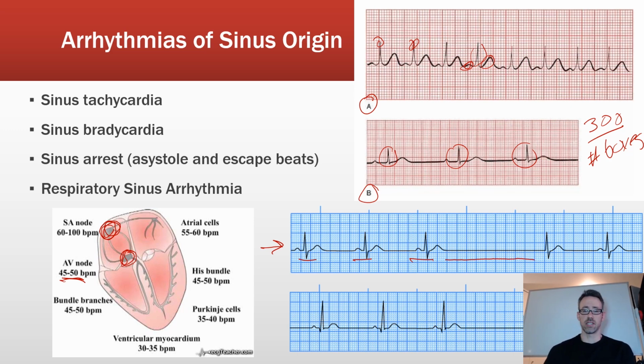And so that's our asystole there. The SA node had stopped firing, and then you'll notice this complex right here. Something you'll notice about it, if you're paying attention, is that there's no P wave, or at least you don't see any P wave preceding that QRS. The QRS is nice and narrow, and it's got its T wave, so it's repolarized. Okay, but there's no P wave.